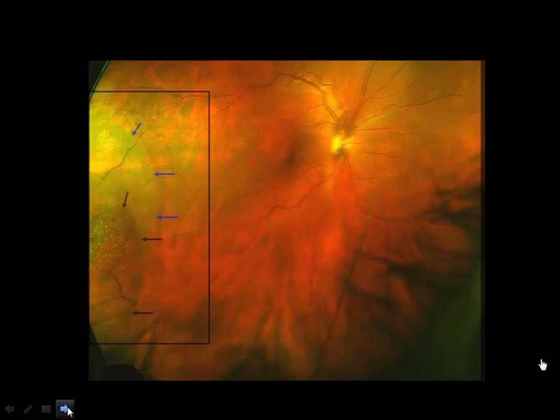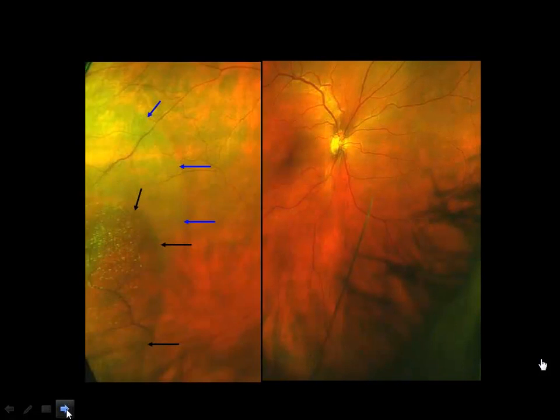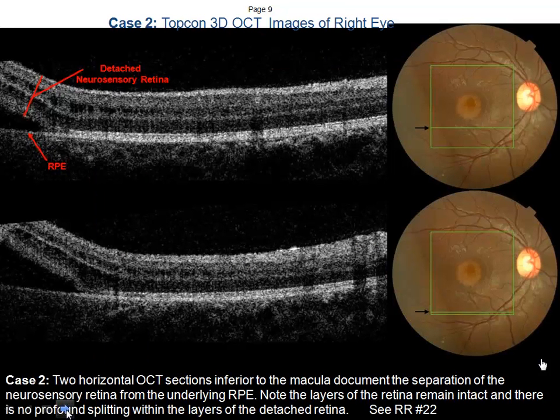This patient happens to be an optometrist and he's asymptomatic. He has been looked at carefully over the last several years. I've only seen him once. He's from down south, and he has not changed. So retinal schisis, retinal detachment. Here we get closer to the central retina.